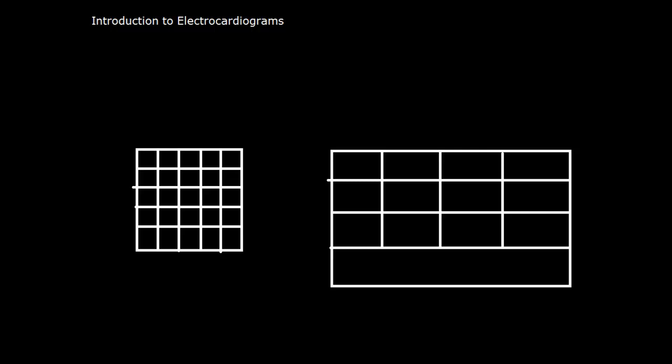This is part one of an introduction to electrocardiograms. It's probably going to be a couple videos, but I'm trying to give you a really basic overview of electrocardiograms and the things you should know about, at least going into the wards. So just a little bit of trivia.